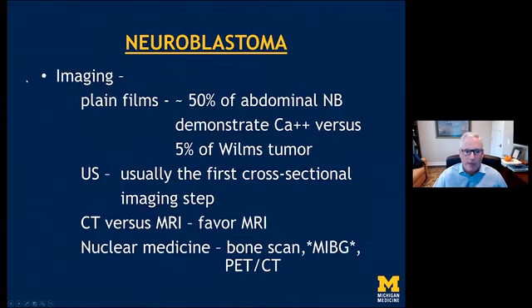Now, for the imaging, if you do have radiographs, about half of neuroblastoma will demonstrate some calcification. May be hard to see, but if you see calcifications, you're much more likely dealing with neuroblastoma than Wilms tumor. They're right off the bat by statistics.